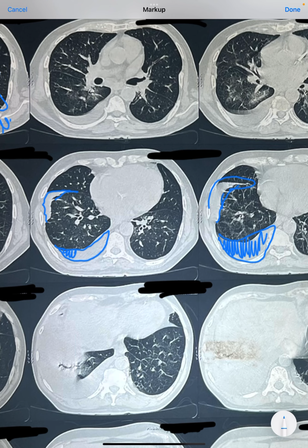But this is against the gravity. Even though the patient is lying down, the fluid is accumulated above, so it is not settling down. It means that this has to be loculated. This is blocked or clogged. So there must be a pouch of pleural effusion which is out there. Such pouches are very, very commonly seen in tuberculosis. So in India, one of the most common causes of such loculated effusion is almost always TB.